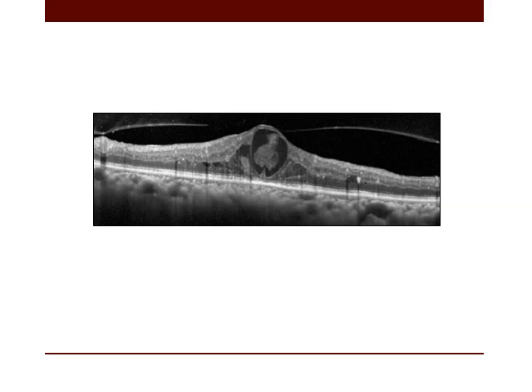Why? We should take long line scans, not only in one direction, but in all directions of the macula. Why? Because we need to see peripheral changes in the macula. As in this case, we see it's a partial PVD. There is some epiretinal membrane seen temporally in the macula. Changes extend to the macular periphery, thickening extends to the macular periphery. So it is very important to have full information about the macula, not only about the central macula.